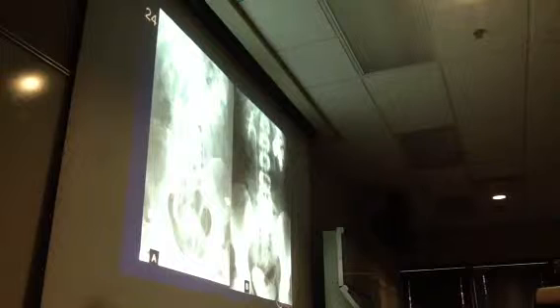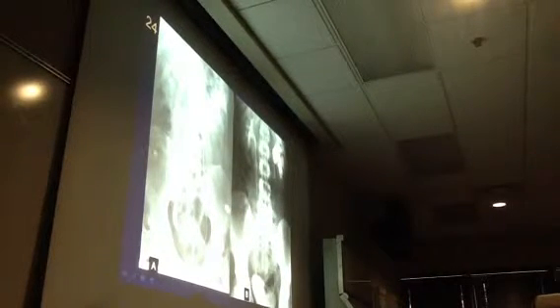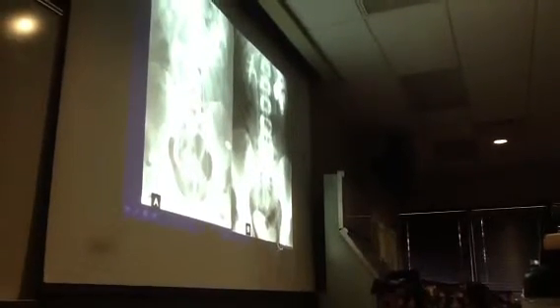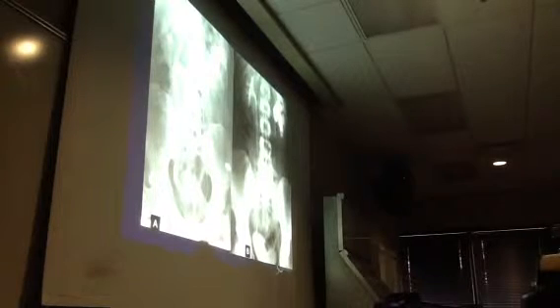Isn't the right ureter blocked because it's very, very thick? Yeah. So what's happening when they do these studies, they do them to assess are there any blockages, and you can see that the ureter on the patient's right side is very dilated. So there's a problem with the right kidney and the collecting system there. There's some chronic inflammation, chronic obstruction.